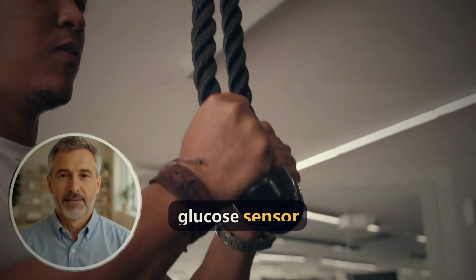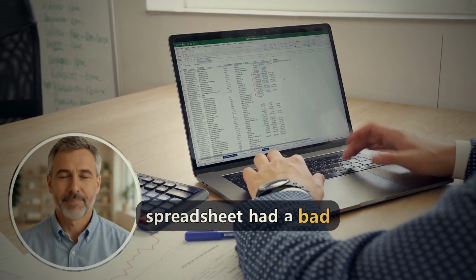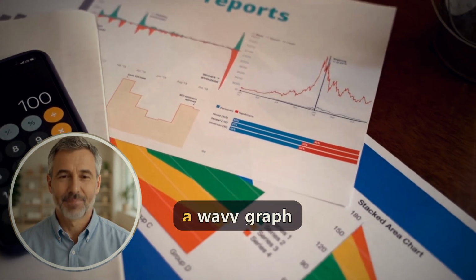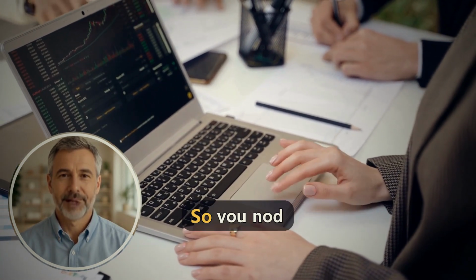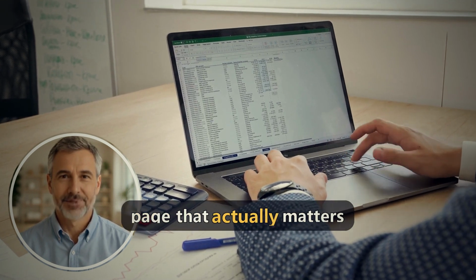If you were a glucose sensor user, at some point you get handed a report that looks like a spreadsheet had a bad day. Letters like AGP and GMI, a wavy graph, a stack of percentages, and absolutely nobody explains what any of it means. So you nod, you file it away, and you miss the one number on the page that actually matters.